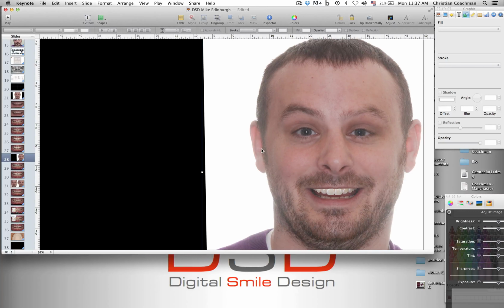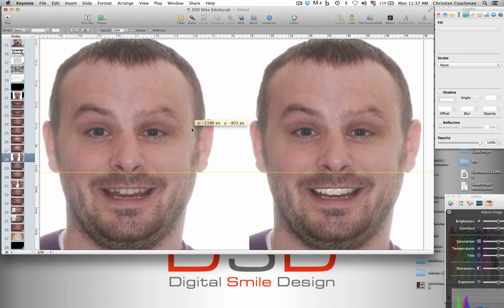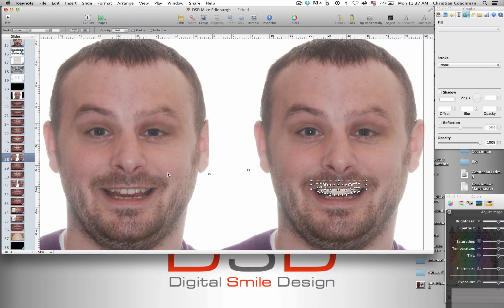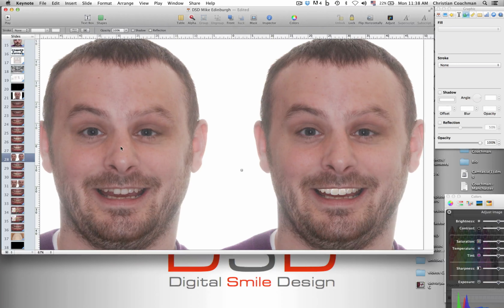Now I click on the picture and I duplicate the picture. So now, oops, I'm sorry. I can ungroup them. Okay, ungroup them. And if I click on the picture, I duplicate the picture and I have the pre-op. Before and after. I'm just trying to center here to see. That's it.